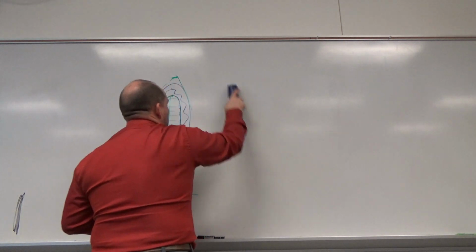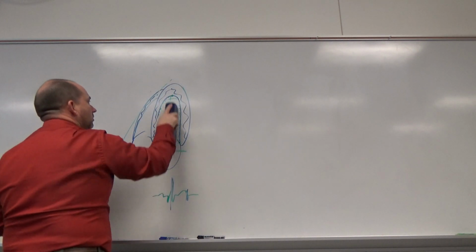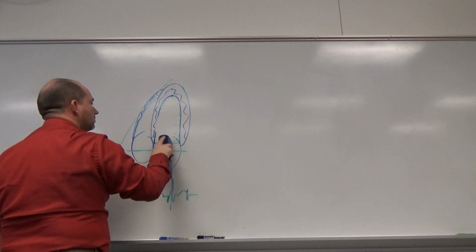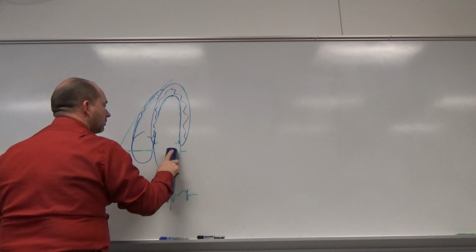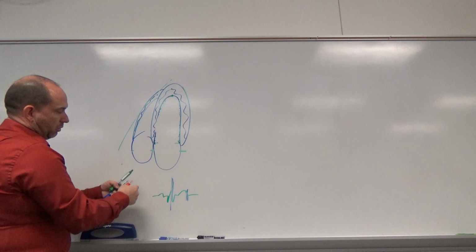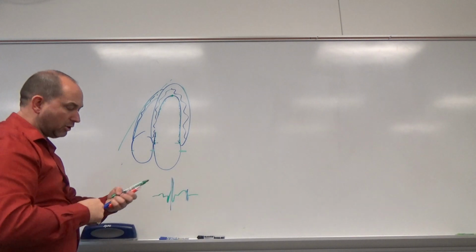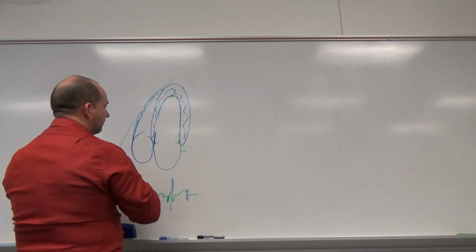Okay, so we would normally do our Simpsons first. Just erase all this in here. Redraw the valves. Okay, so we go back out. You want to see a good centimeter to 2 centimeters beyond the heart, in this case, the left atria.